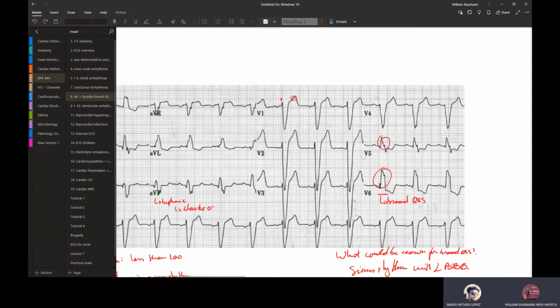Right? Yes. And the other observation is that you have a broad QRS. Okay. Good. So your V1 to V3 is just very negative, which is also not characteristic. It should be positive because you're detecting it going towards that side, right? So that's something to be alert with.